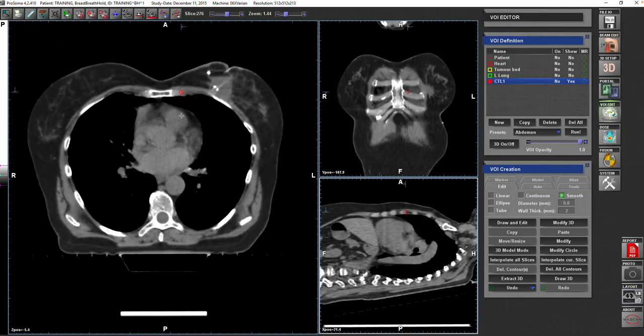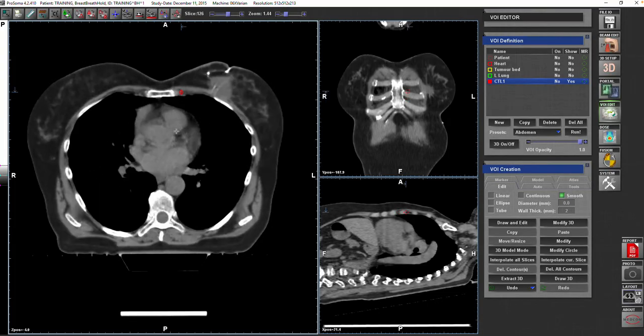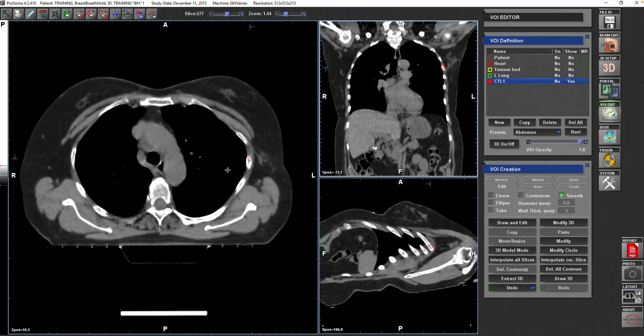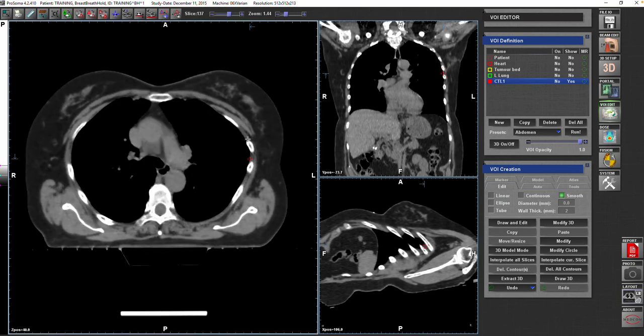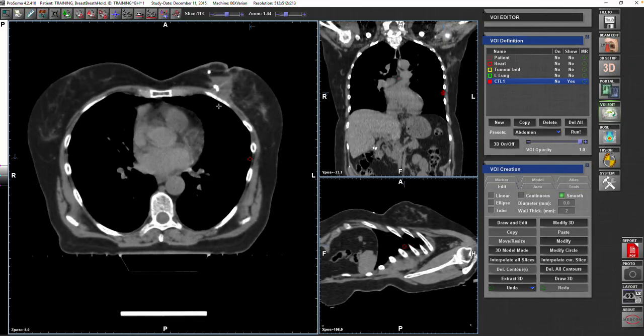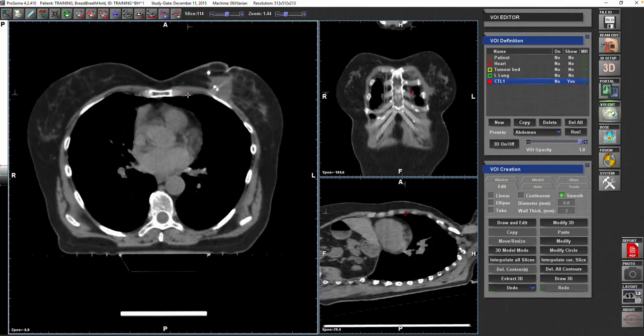So it's the fourth rib. It's easy to see. It's easy if you do it the way I'm doing it. I'm counting it in coronal. So 1, 2, 3, 4. Here you are, and then go to the axial view, and follow it till it joins the sternum. And when it joins the sternum, this means that we are just above the fourth rib, which, if you look at the sagittal view, then you know that you are in the right place.